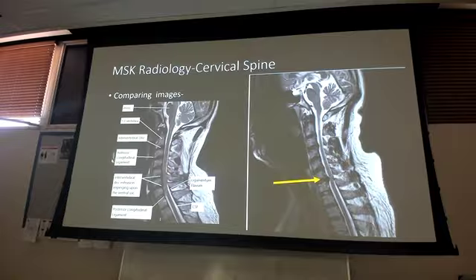Again, more common in the lumbar, we'll look at lots of lumbar ones as well. So this is why I say this would be the only MRI I would make you find the abnormality on, because if you just follow it down, you can look and see where it's at. Okay.